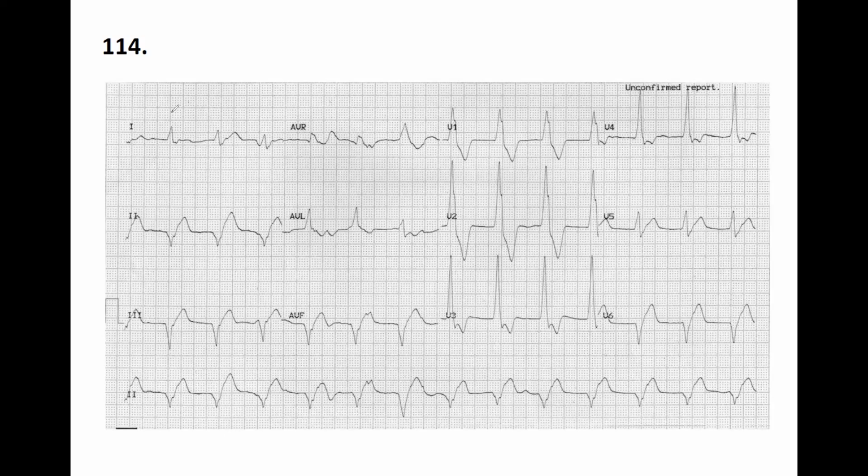So the axis is in a negative range, and AVR is about 0 or so. So that's between minus 30 and minus 60. That's an extreme left deviation, but that's a ventricular rhythm. It can be anything. It doesn't mean a lot because the impulse originated from the ventricle, because the QRS is wide. Exactly. And the T, the repolarization, is exactly the opposite. Very good.